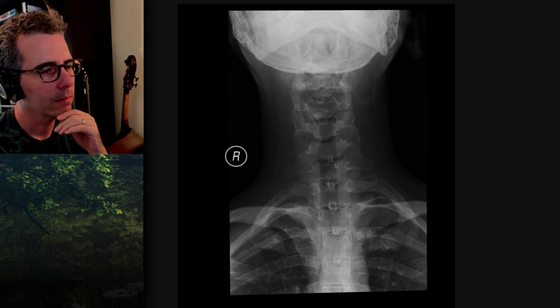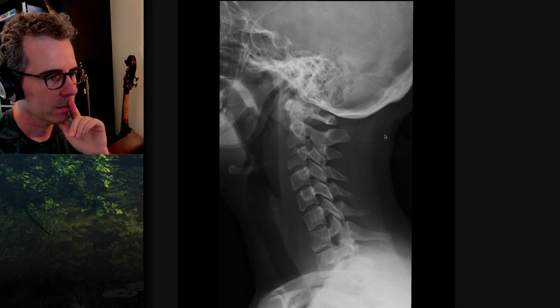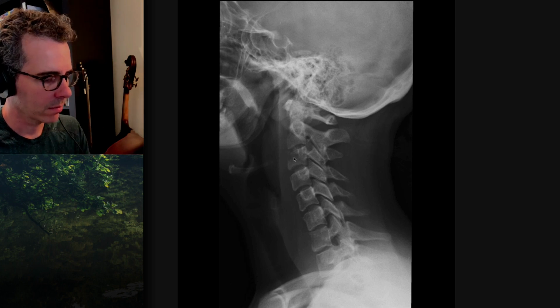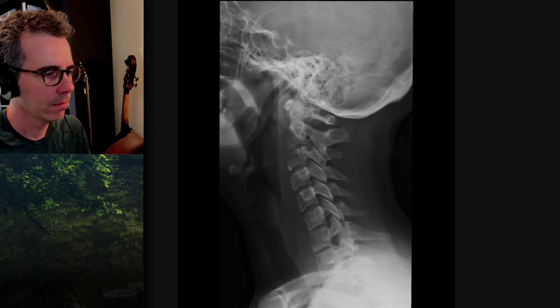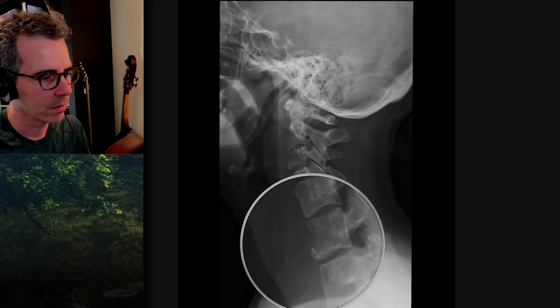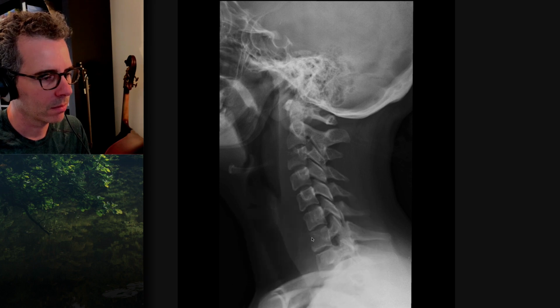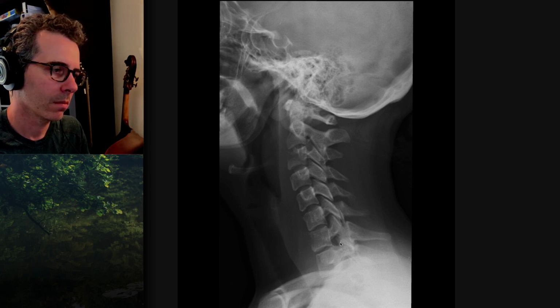So cervical spine x-rays in a 25-year-old male. I'm just looking at the lateral. There is significant prevertebral soft tissue thickening and swelling. And there's also bony destruction involving the anterior vertebral body and superior end plate of C3. And C7, the anterior aspect of the C7 vertebral body also appears irregular. The intervertebral disc spaces, however, are preserved, and alignment of the cervical spine is normal.